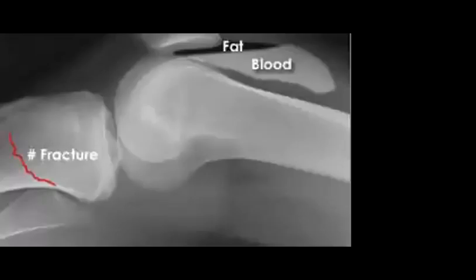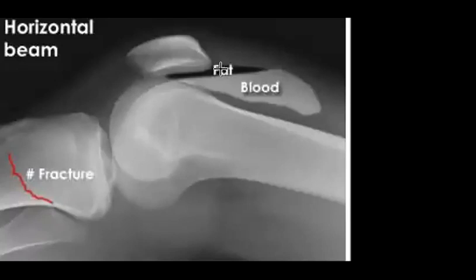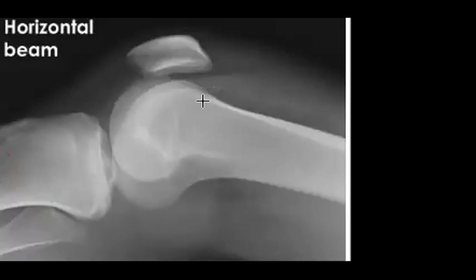For example, here in the knee, it's good to check for something like the fat fluid level, which is sometimes subtle, and gives you an impression of what is called lipohemoarthrosis. You find the fat, which is the black lucency, and the blood.